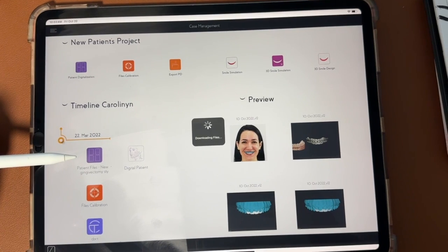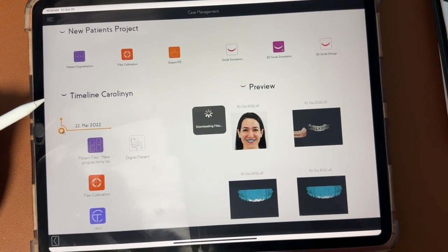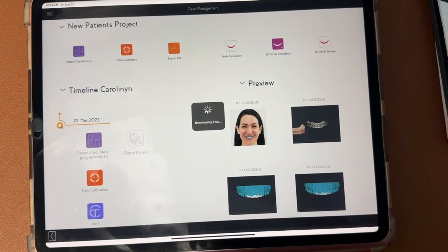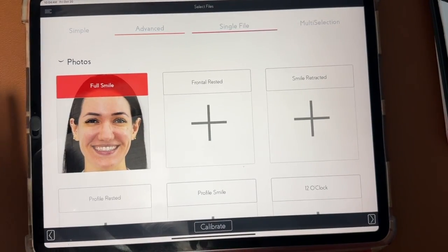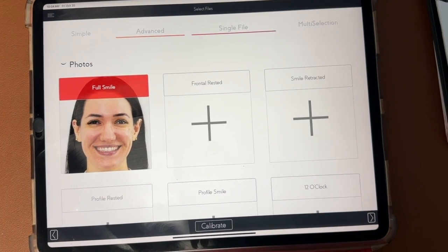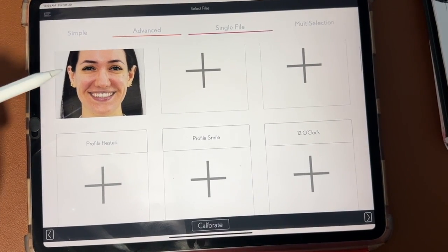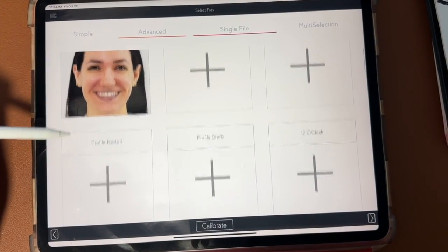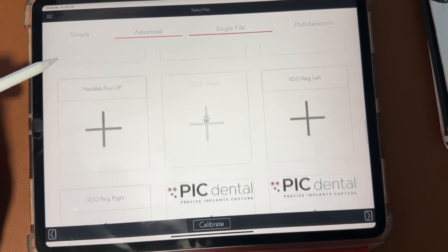Just make sure that when you upload the file here, you compress this folder as a zip file. In almost 100% of cases, you will get a folder with probably like 1,000 little files, which is kind of like the slices from the CBCT. But in order for you to visualize it in here, you must compress the whole folder into a zip folder, okay?